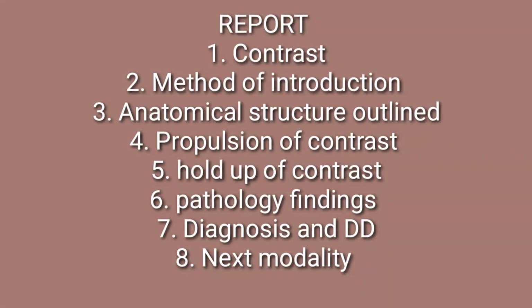First, try to give your own diagnosis, and if you can sum it up with a differential diagnosis, that would be great. And last but not least, you should mention the next modality, because for management and for other diagnostic purposes, you need the next modality if your physician or colleague wants to confirm this diagnosis on other radiological imaging. So this is the report writing method, and your report should have all this information in writing so that your colleague can benefit from your report.